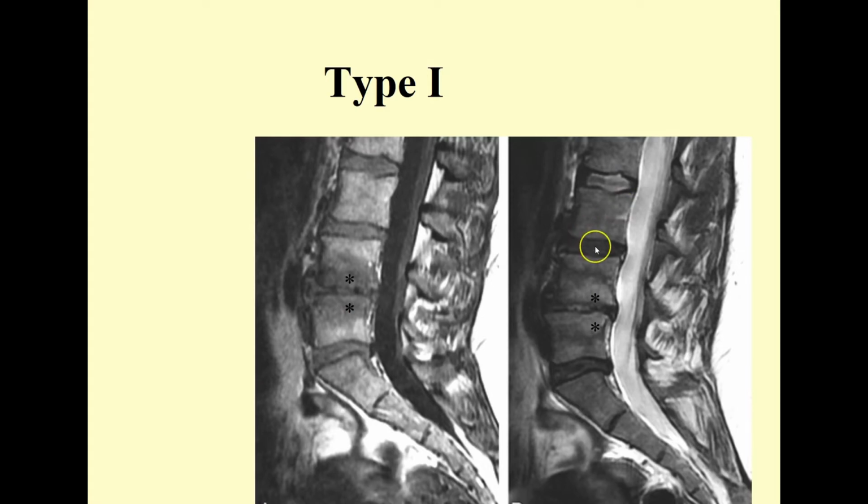Decide whether you're dealing with a T1 weighted image or a T2 weighted image. I'm going to suggest you look at the central canal at the CSF. So again, what gets highlighted is fat. That explains this hyperintense epidural fat here. In this vertebral pair, L4 and L5, we see a kind of roundish looking decrease in signal intensity. Well, that's what would happen if water displaced the marrow signature. Take the patient over to the T2 weighted image, again, go to the central canal, and I can see it's brighter. So we're seeing the result of water, which is the large constituent of cerebrospinal fluid.